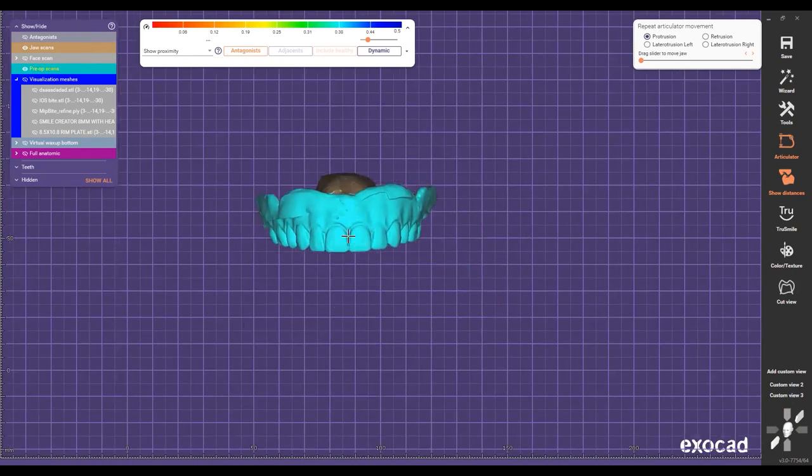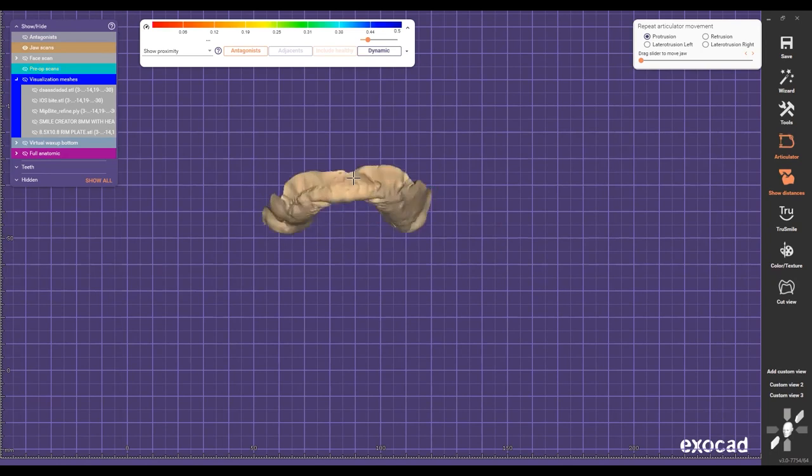That's why I try to educate doctors that are doing a lot of surgical guides: just don't plan your implant position or surgical guides on this, because if my smile design is going to be way different, then the implant plane is going to be in a different position from my smile design. So always do the smile design and then plan your case, so it's going to be more accurate than me doing my guides following this denture. Okay, because history is to start from the face, from the outside to the inside.